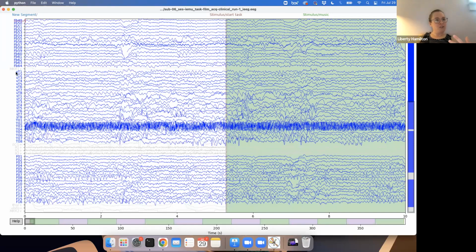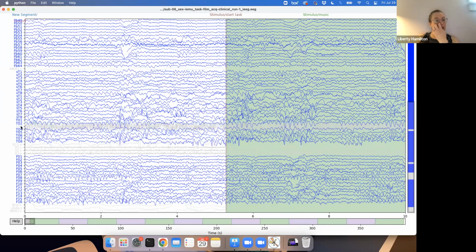But if you do encounter things where you see a channel like this, for example, this is very likely not a neural channel. And this really fuzzy one that you see here is a good example of a bad channel. What I mean by bad is often the electrode contact might not be good with the brain physically. It also could be that it's not plugged in very well. Each of these has to be plugged in individually to an amplifier, and if it's slightly pulled out of its socket or something like that, or there's any damage to the wire, then you can get a bad electrode.